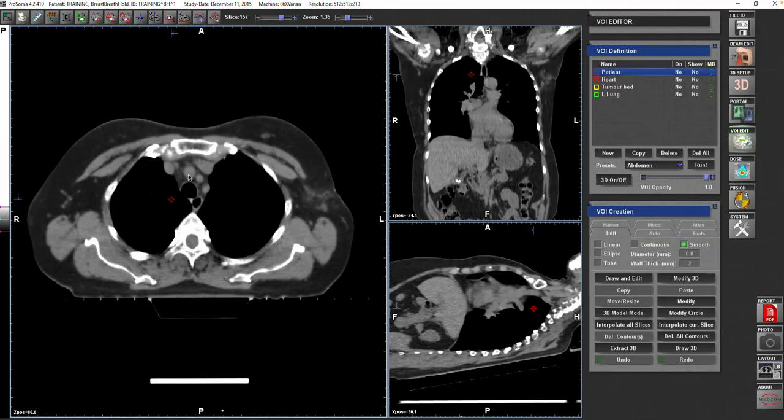This brachiocephalic trunk will give us the right subclavian artery as well as the right common carotid artery. This is the most important part, because we will use the subclavian vessels, artery and veins, in our target volume delineation.